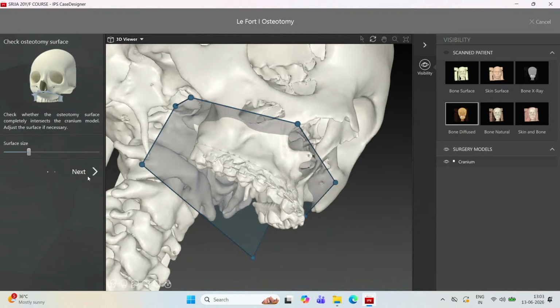When I'm happy with that, we go ahead and click on to next.